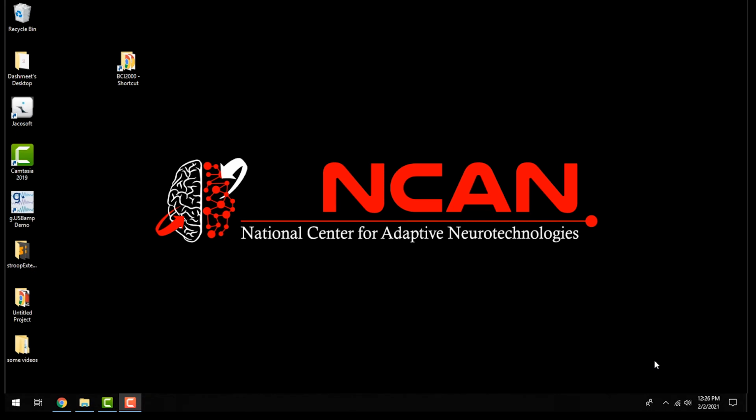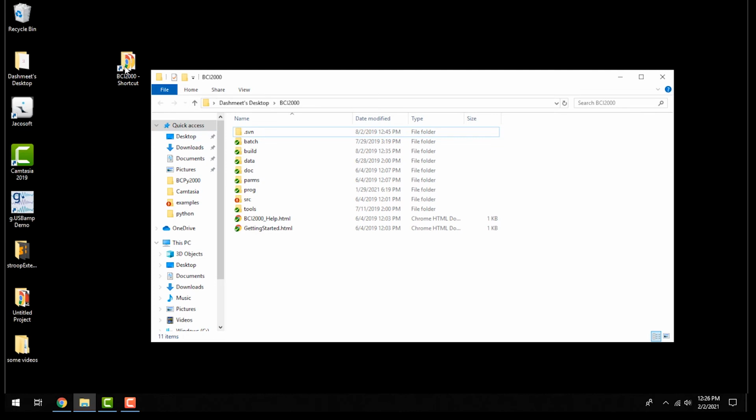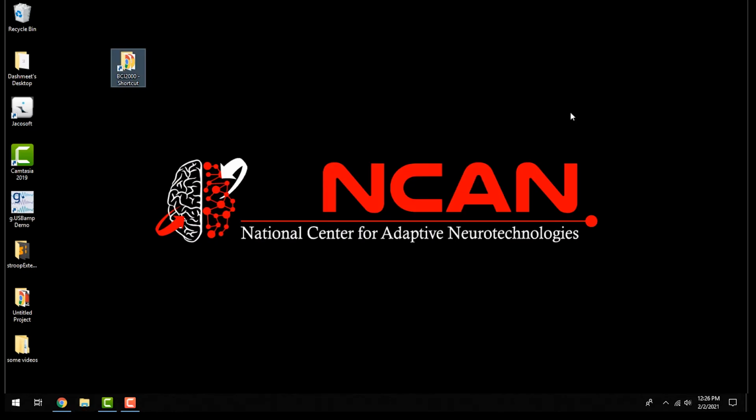So now that we've verified that we can connect to the amplifier with the EGI iMac and everything is set up correctly, we can move over to the research PC. The research PC will be running BCI2000, which I've gone ahead and installed already. You can follow another video on this YouTube channel for some direction on how to do that. I have my research PC connected to the network switch box that the amplifier and EGI iMac are connected to over Ethernet cable.